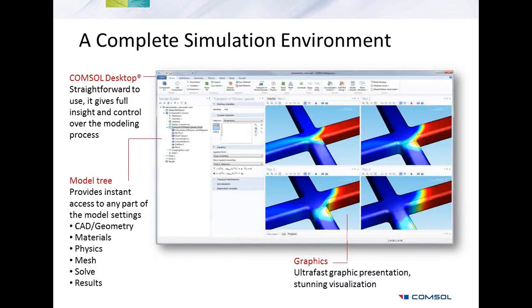So let's briefly explore the COMSOL desktop. Our interface is quite straightforward to use, where all the modeling steps are recorded and can be edited later on if needed. This actually happens in the window referred to as the model builder. We input or select our custom settings in the window just next to the model builder and then visualize our results in the graphics window. Clicking on a specific physics node in the model builder allows you to view all relevant parameters and equations in the settings window. It is also possible to evaluate and couple several model components in the same file.